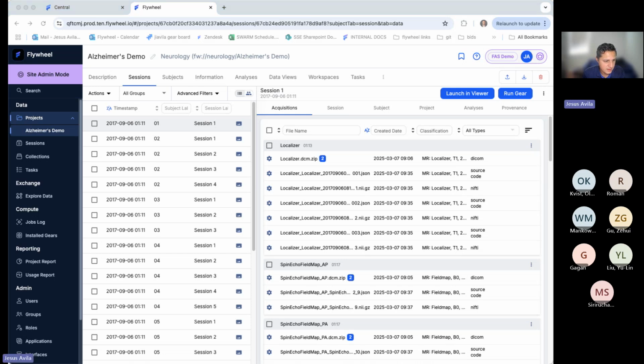All right, we talked about tagging, so we'll talk about groups and tags, what that means. As mentioned, we can use these tags that are added to files to trigger these gear rules. Let's say you're doing manual tagging.